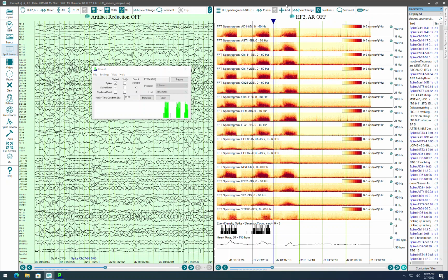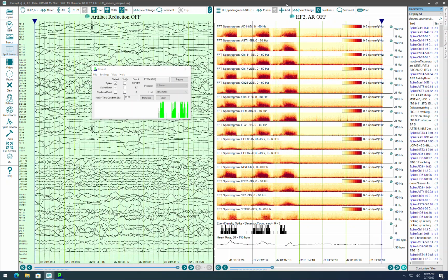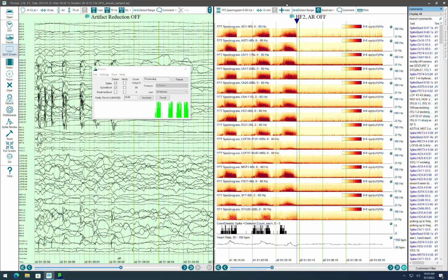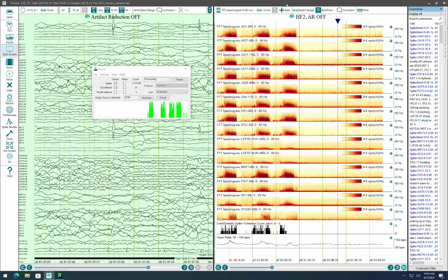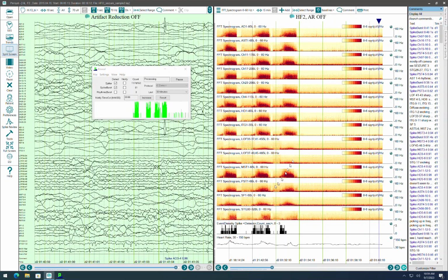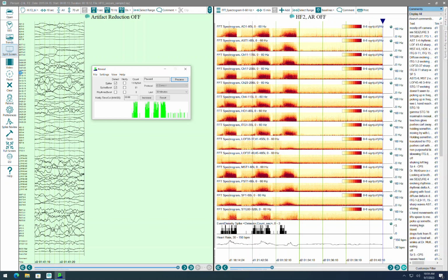And you can see they're processing at different speeds. The detector will actually catch up at the end of this processing, but we'll let it go ahead and finish. And it's approaching the end of this file. It's done. So there are the spike indications here. Let's go ahead and pause the detection. It's going to ask me if I'm sure. We'll close that. And we'll go ahead and pause the trending over on the left as well.